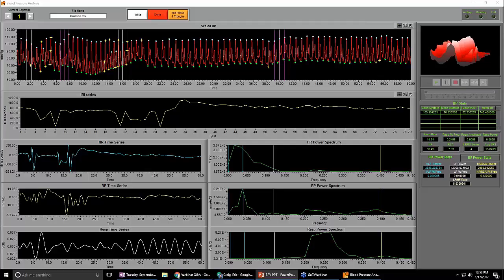And basically what you can see here is baroreflex events, and they're shown as a sequence of cursors. The purple ones represent an ascending BP sequence, so that's a lowering of the heart rate, a descending heart rate sequence. The white represents the descending BP sequence, and so a faster heart rate sequence. So that's the difference between the purple and white that you're seeing on there.